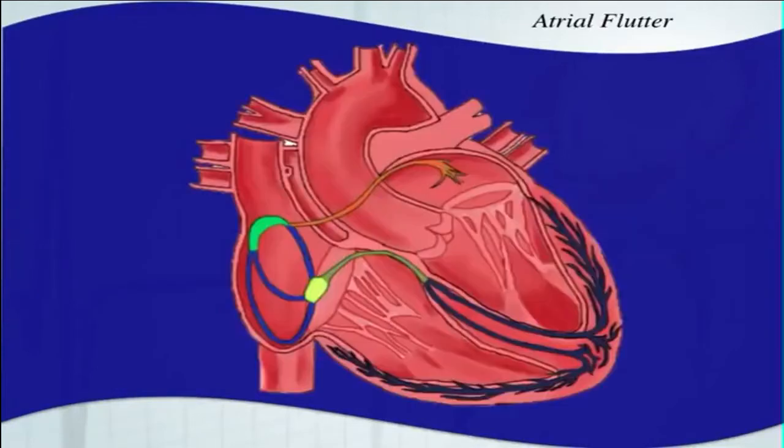Moving right along to atrial flutter. Now, atrial flutter is a much different type of tachycardia. This is considered a reentry tachycardia. What happens is somewhere in the atria, a lot of times it happens like this, you'll have depolarization, and then that depolarization will stay in this reentry.